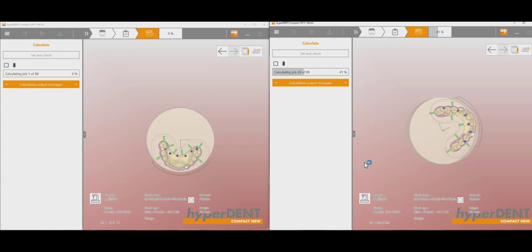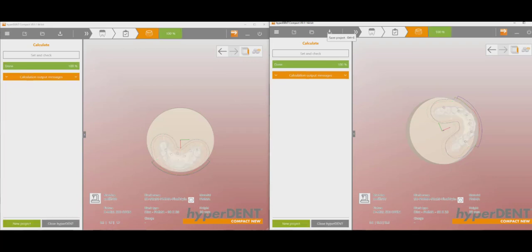So we'll let these calculate. This should take about 20 minutes. So I'll just pause the video and we'll let those finish calculating. Okay, so that took about 20 minutes, and so we've got 100% complete on both calculations.